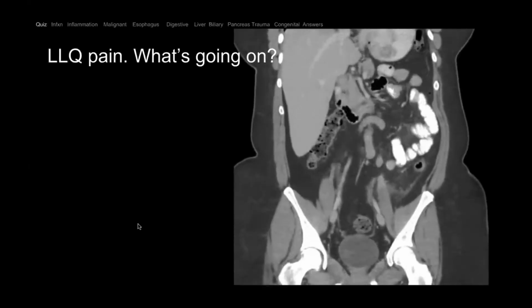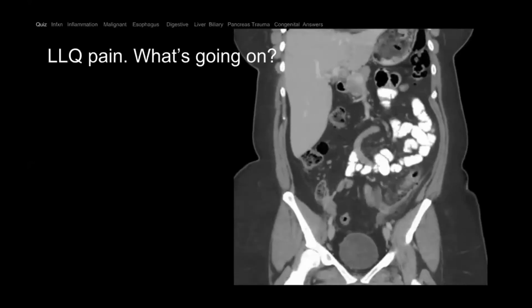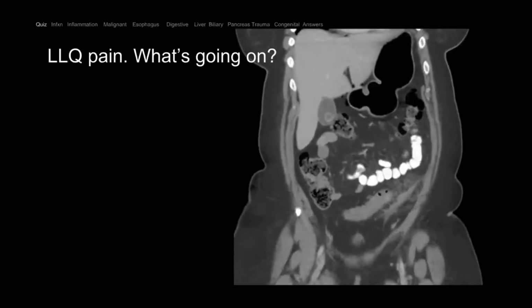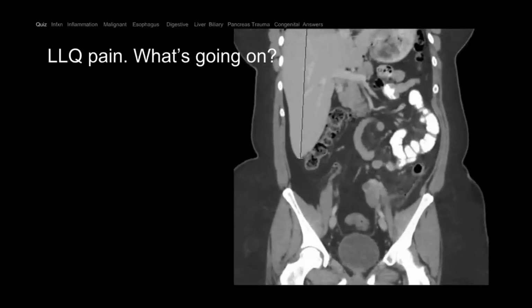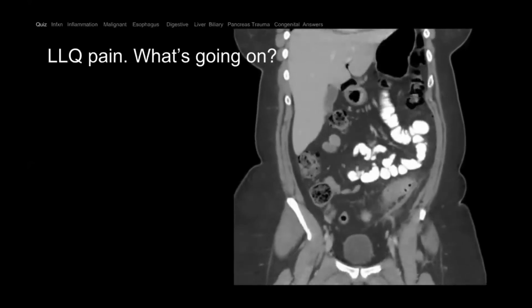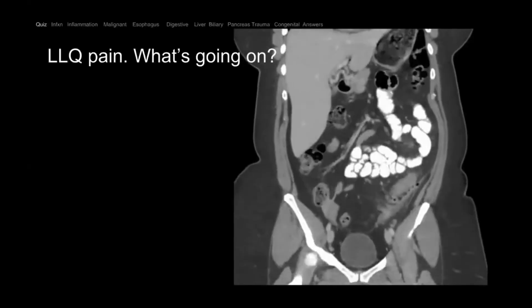This patient presents with left lower quadrant pain. What is going on? Left lower quadrant pain, what is going on? So Jordan thinks diverticulitis. Okay, good. Anyone else? Diverticulosis? Good. Ulcerative colitis? Good.